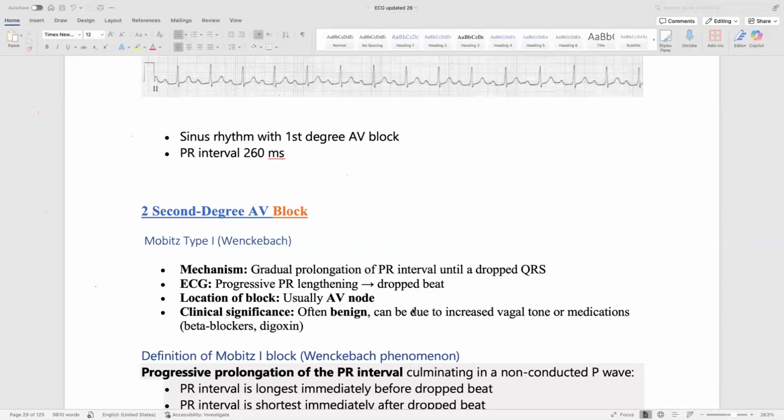That means it is acting with some rhythm. Listen, it is alive and nearly well. So type 1 is benign. Still, there is some organization there, not like the coming one.